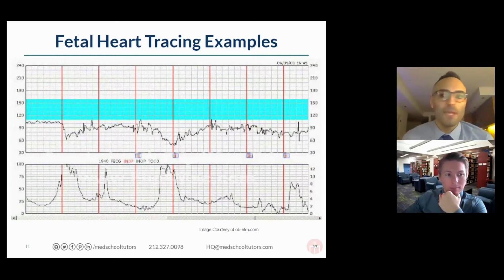So I'm going to make this even a little bit more challenging now and give you a clinical vignette scenario. A 38-year-old woman gives birth to this baby who there was no complications, but this was on the fetal heart tracing. The baby has an interesting rash on the face and has now stayed in a complete heart block in terms of the baby's EKG reading. What? Oh, wow. Wayne Broth, that was fast. Okay, so that is correct, neonatal lupus.